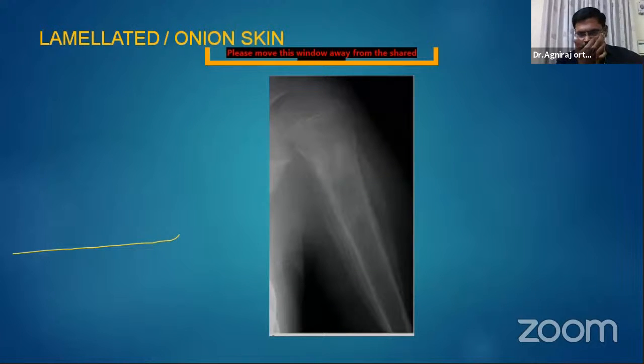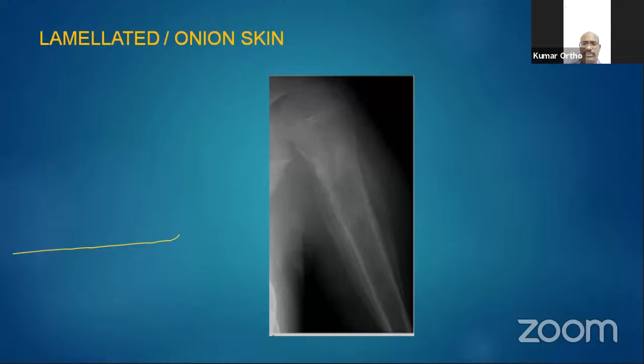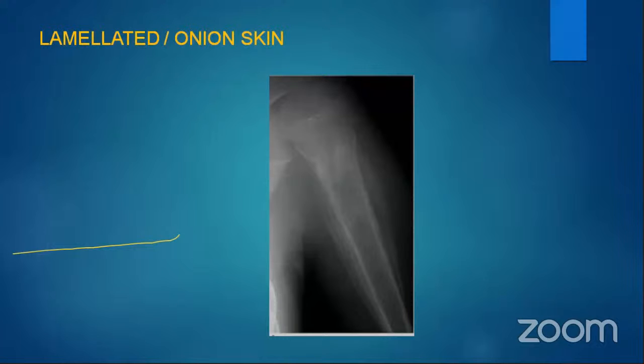Veeramani, you say the diagnosis for this, or you read the X-ray. So we should say what are the things you should say. I will repeat. You should say age, location, border or zone of transition, type of lesion, periosteal reaction. Sixth one is... Veeramani, come on. Yes, Veeramani, are you there? Then we will call Gautam.